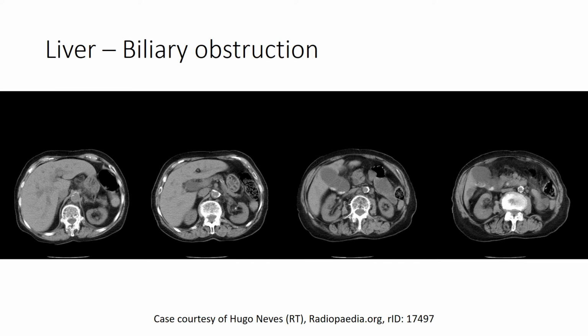Okay, let's move on to some more quick fire slides with different pathologies of the liver, starting with biliary obstruction. Again, pause the presentation to take some time to look at these images, highlighting the important findings. You know we're looking at biliary obstruction, so see if you can find what you expect to.